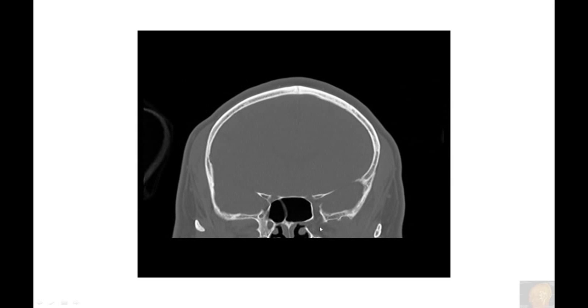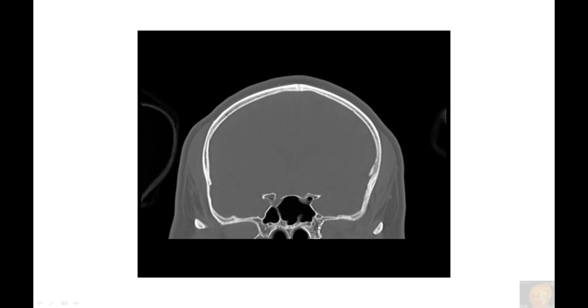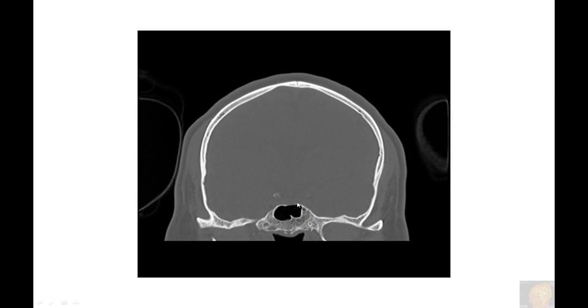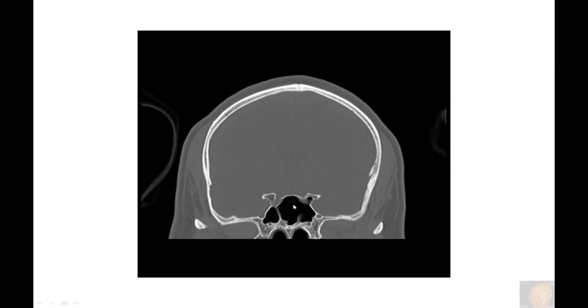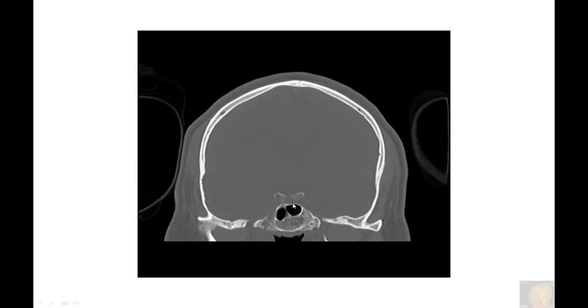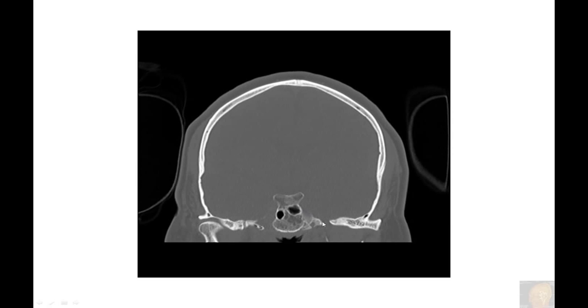That's a more complicated. They meet together in the pterygopalatine fossa. And the cranial nerve 5, which is the trigeminal nerve, the third division, the mandibular division, exits through this hole. It's called the foramen ovale. This is more anterior. This is the pituitary fossa, sella turcica. They are the same thing, where the pituitary stays.